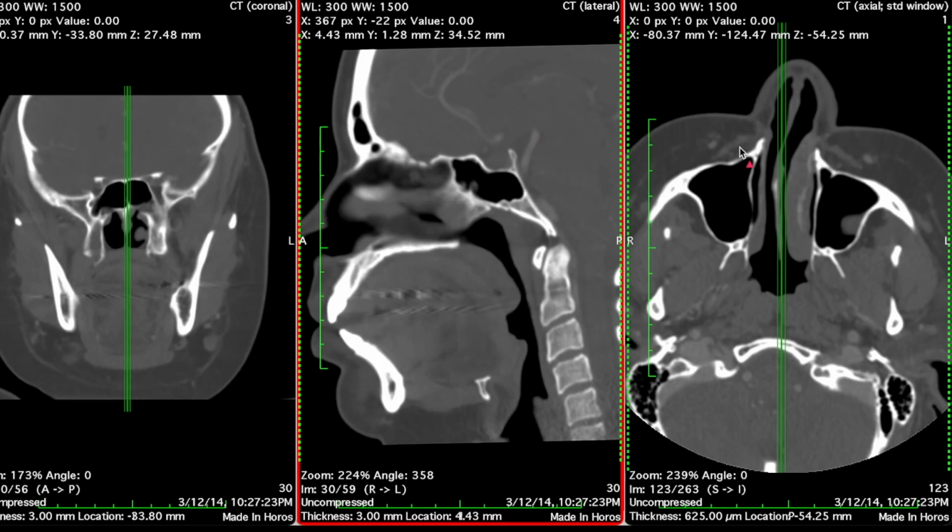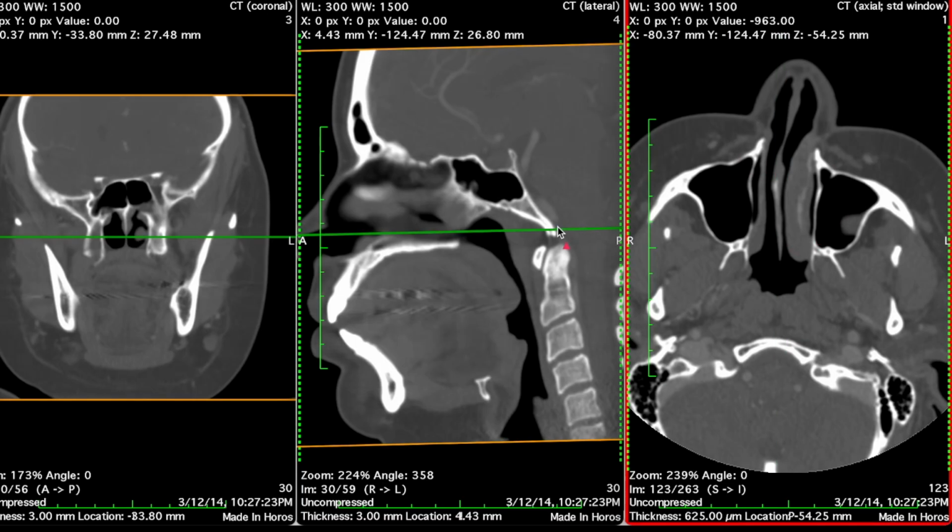Before we move on from the nasopharynx, there are some structures that I'd like to show you, and it requires adding an additional axial view, which I have here now on the right. So I've scrolled this axial view to about this level, and we're going to hit on the nasopharynx here. In the axial view, whenever you add a new view, it's always great to orient yourself to try to find the nasopharynx.